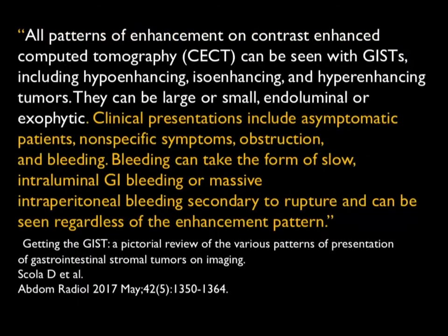A range of enhancement patterns. Sometimes they're fairly vascular, sometimes they're hypovascular, sometimes they're necrotic. These tumors can bleed, and it's not the large GIST tumors, it's the small 1 to 2 or 3 centimeter lesions that can be the source of unexplained bleeding. And we have picked up many GIST tumors, not that we're looking for small bowel tumor, but we're evaluating the patient for small bowel or colonic bleeding.